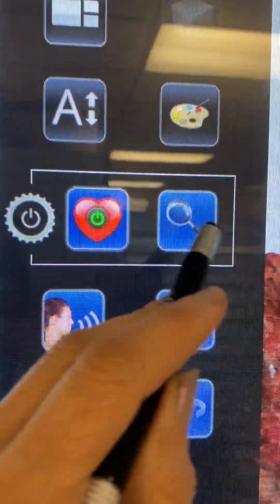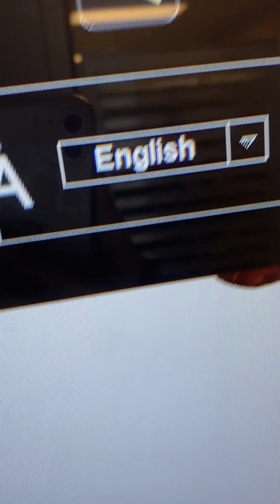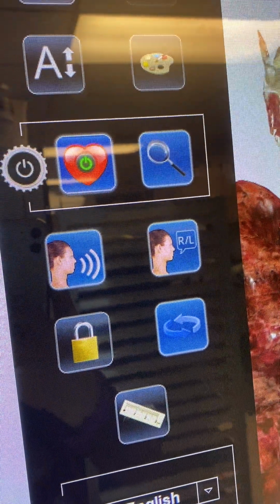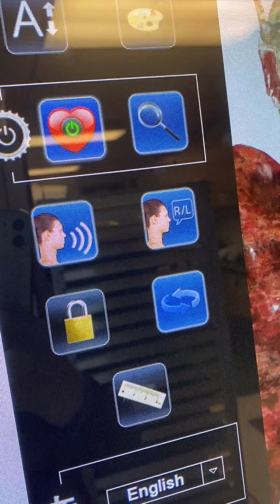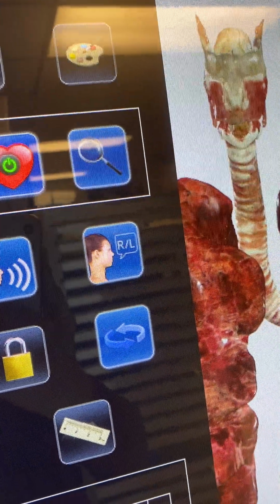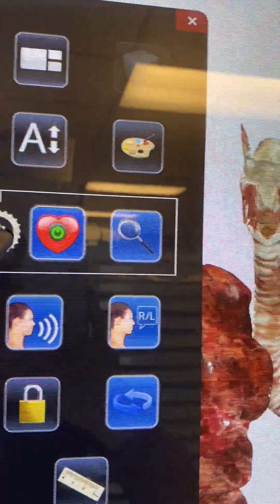You can see these two icons on here, and also you can see it in here. And again, I will explain that. You can look for the video how to use live mode tool. The next one is how to use the structure pronunciation. I'm trying to explain them in order.